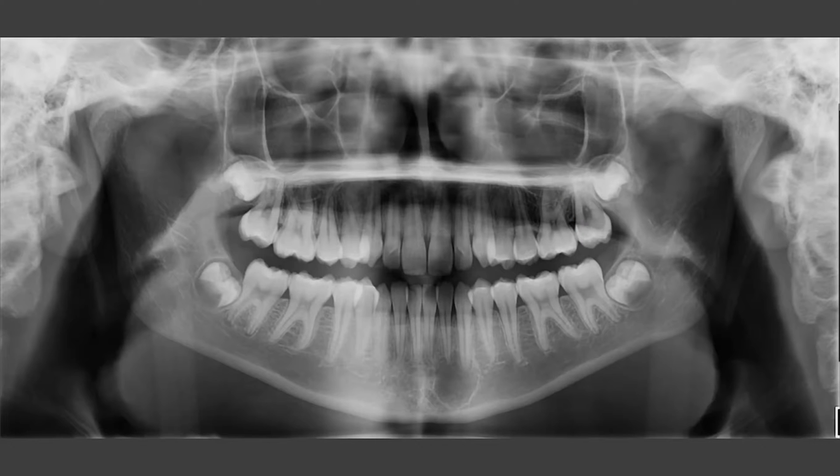As part of the standard protocol, you will begin your interpretation in evaluating tooth number 1 to tooth number 16. Then from number 17 to 32. This way, you will not miss radiographic findings. You will review all the teeth. Then you will come back to the area of interest.